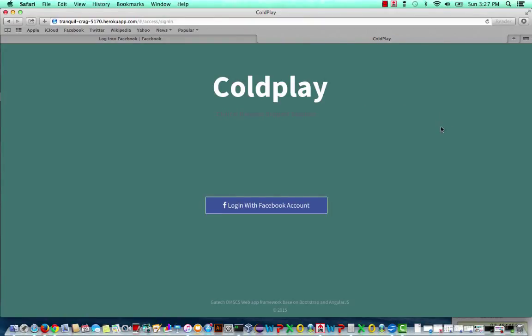Coldplay is a machine learning solution to help clinical decision making. Based on FHIR data, which are used as the training set, doctors or specialists can enter a test group by uploading a file including patient data to tell who would be likely to have diabetes.